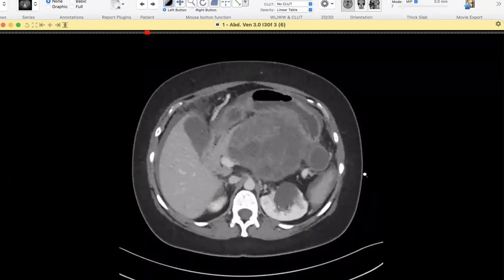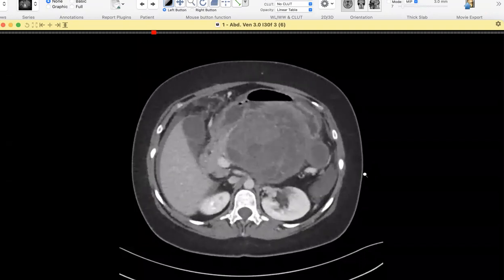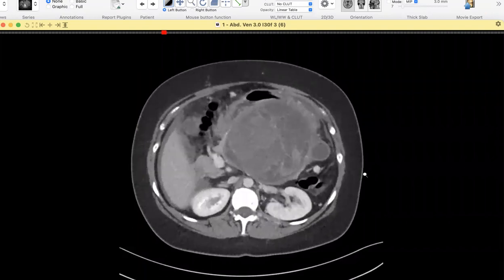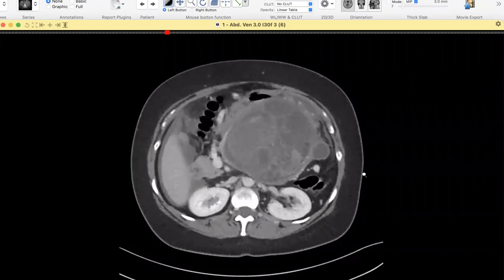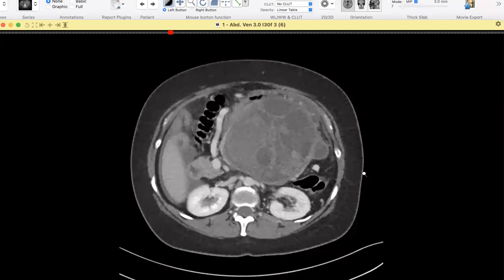but the neoplasms can be benign or malignant. Yeah, but more of a benign etiology because it has displaced the surrounding structures. It hasn't invaded any vessels. There's no surrounding lymphadenopathy. So I would think of a low-grade neoplastic lesion or a benign neoplasm. Fine.